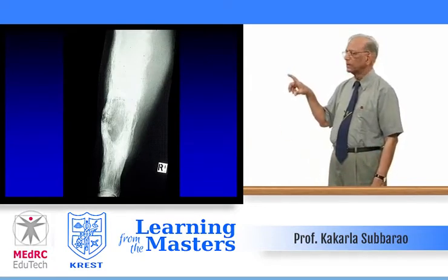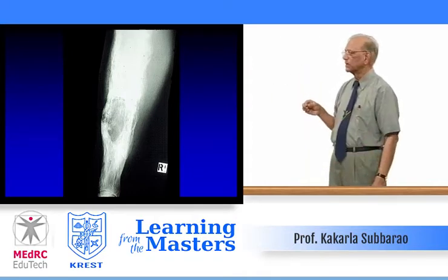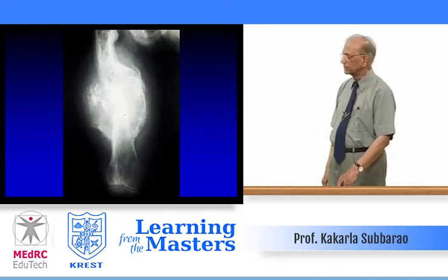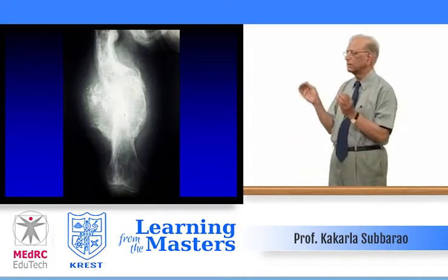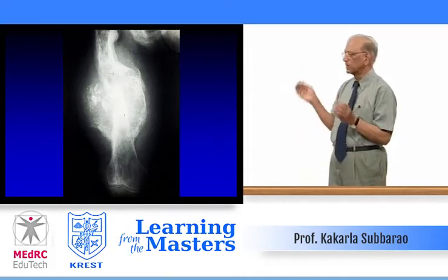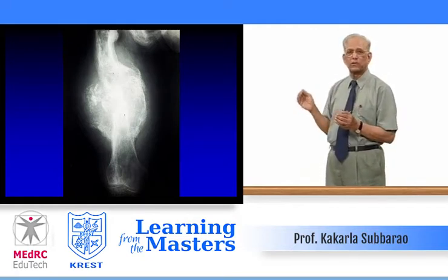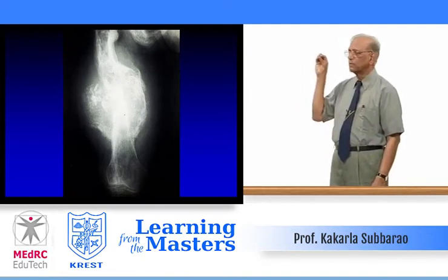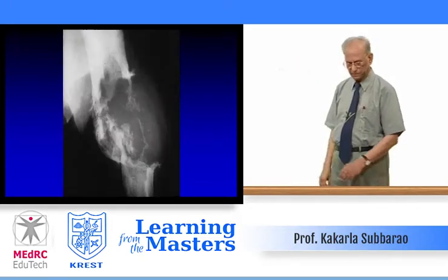Midshaft of the tibia, Paget disease of the bone, but note the oval osteolytic area encroaching upon the cortex and some periosteal reaction due to osteosarcoma. Midshaft of the femur, bulging, pathological fracture, some callus formation. This has to be a fibrosarcoma histologically. Radiologically, you can't really tell. All you can say is that there is a malignant transformation of the existing pagetoid disease.